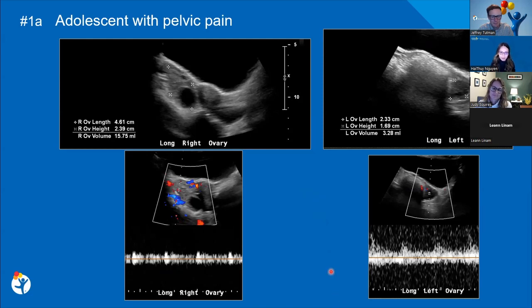And then also about this case, I feel like the right ovary is more midline, because on your midline clip, you can see a lot more of the uterus. Right. Maybe that's another sign that it could be torsion. Yeah, definitely a good observation.